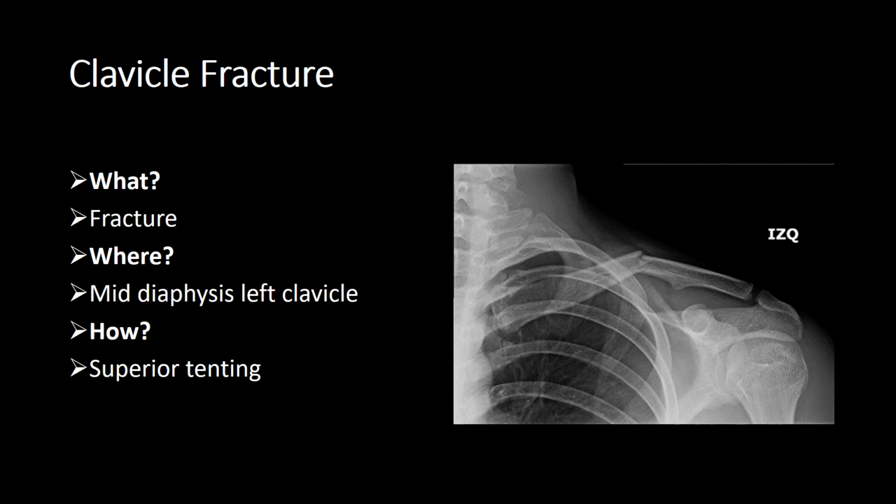When we look at these fractures, it's particularly important to check to see if you can see any rib fractures and to look to see if you have a pneumothorax. Frequent in paediatrics, this particular fracture site tends to be undisplaced and will overlie the rib, so be very careful to check to make sure you haven't missed a fracture there.